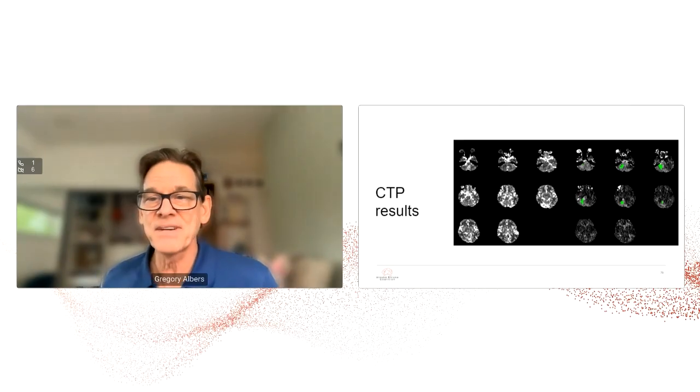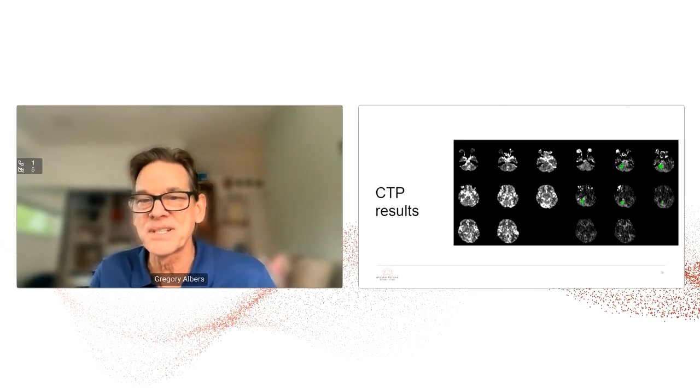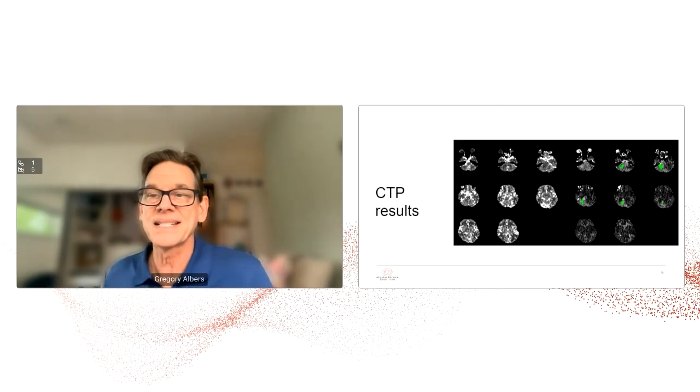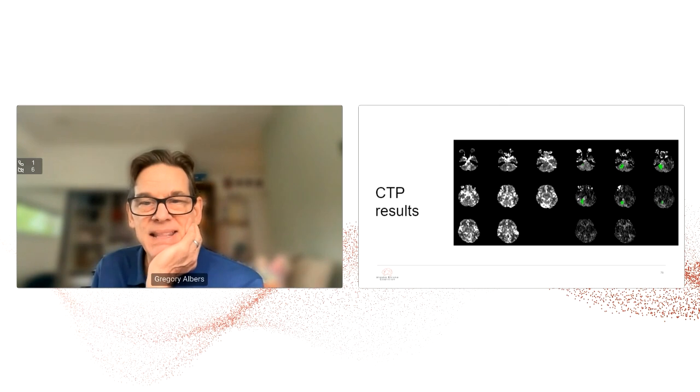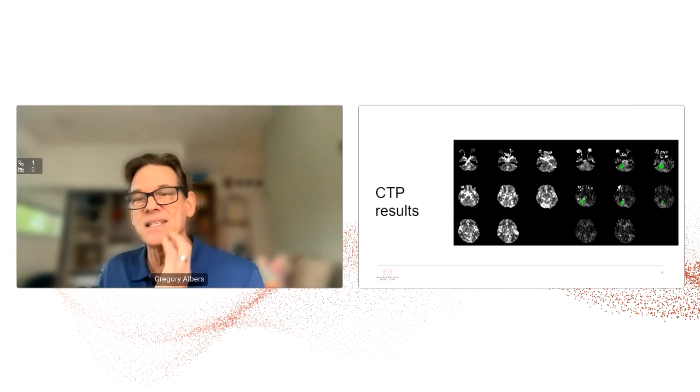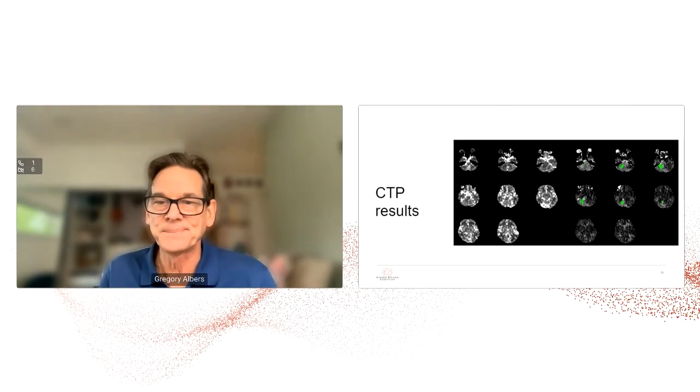So this patient is having a stroke, but it was 6 hours in. And so beyond 4.5 hours, we don't have clear indications to give IV thrombolysis. There are studies that show you can extend the window in certain patients with a perfusion mismatch. But in this patient, the infarct, fortunately, is relatively small at this point. So we would not give thrombolysis at this time.